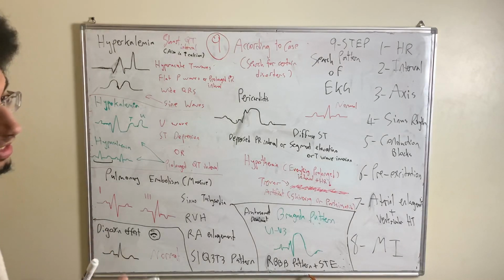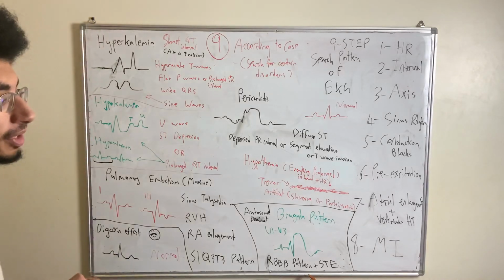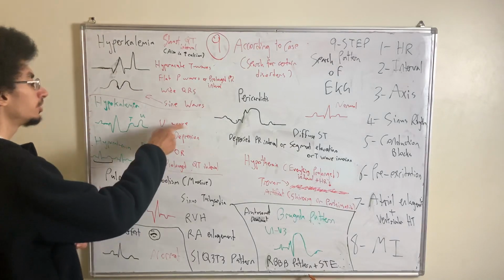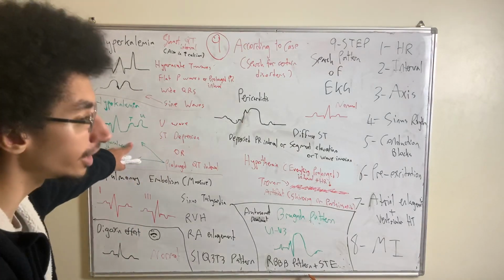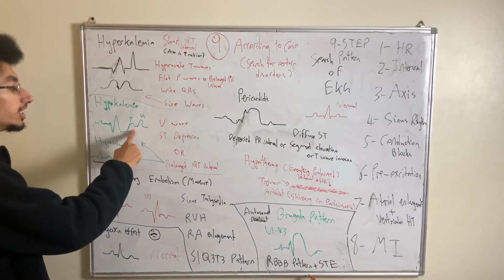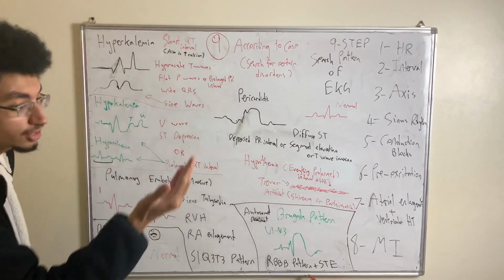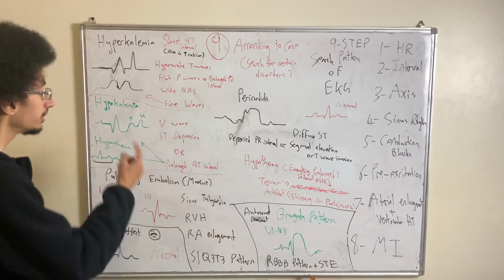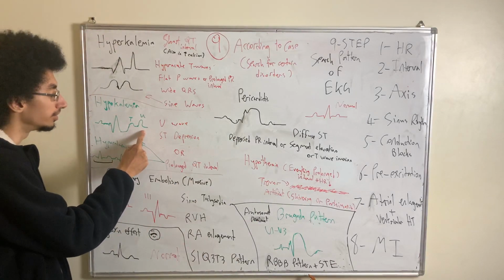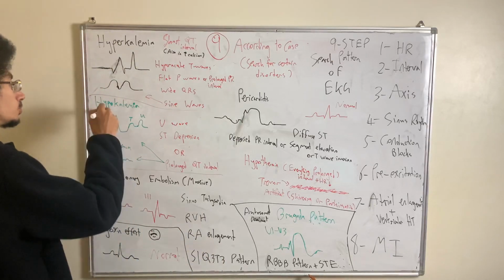And accompanying the ST segment depression, we can have a very specific finding of hypokalemia, and that is the addition of another wave, known as the U wave. So if you have a wave that's coming immediately after the T wave, and it's larger in amplitude than the T wave, this is known as the U wave. And this U wave suggests an abnormality in repolarization due to hypokalemia.